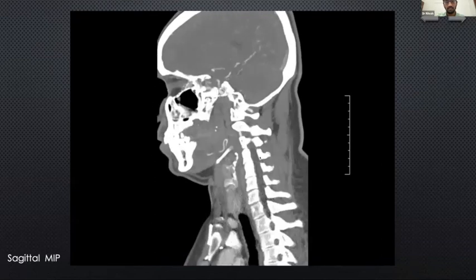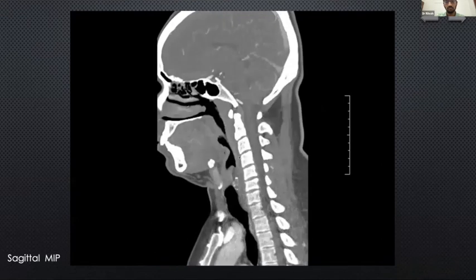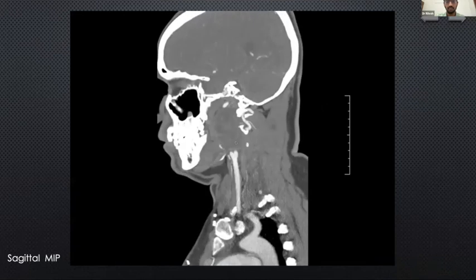But on sagittal images, the same lesion is showing the splaying, but actually it is not reaching the carotid bifurcation. If it were a carotid body tumor, it would be splaying the ECA and ICA right from the carotid bifurcation. So people should not mistake this for splaying and straight away diagnose this as a carotid body tumor. One is the location: even though it is causing some displacement of the ICA and ECA, it is not reaching the point of the bifurcation.